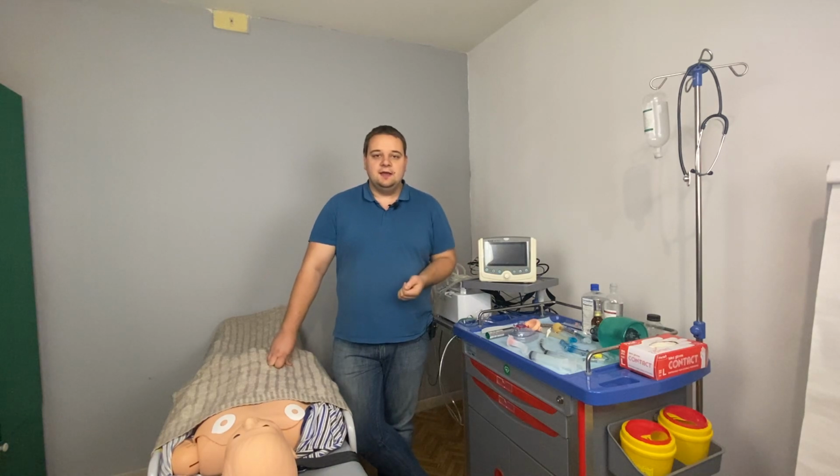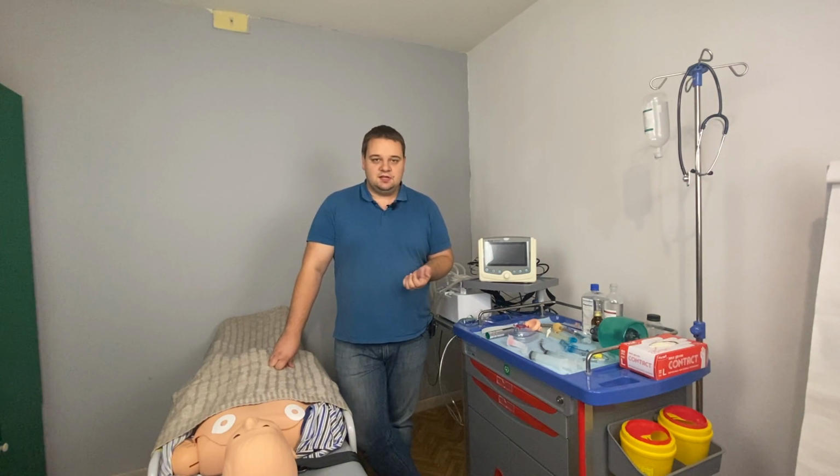The airway is the windpipe, which goes from the nose and mouth through all the upper and lower airways to the lungs. So this is the part of the body where the air is conducted from the outside to the inside, where it does the gas exchange. Airway management is placing an airway tube inside the patient to protect the airway so that it will be operational. Why would it not be operational? We have some indications for airway management procedures.